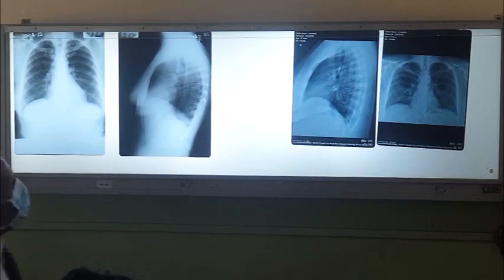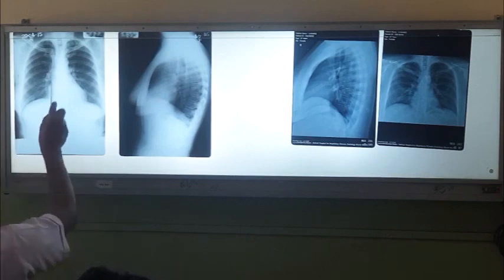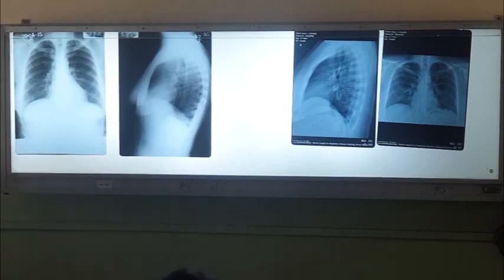So after looking at dates and everything, there are three things that you have to look for before reading the X-ray. Don't go and try to read the X-ray without checking all these things, right? One is whether it has been done in the correct position. If you keep the patient correctly like this, these spinous processes which are here should be in between the clavicle heads, right? So it's a well-centered film, right?